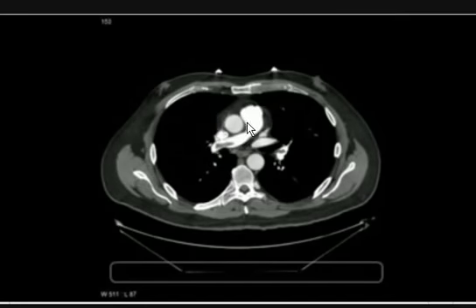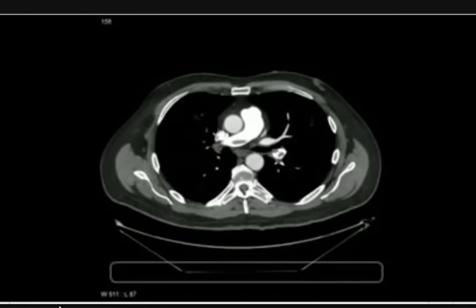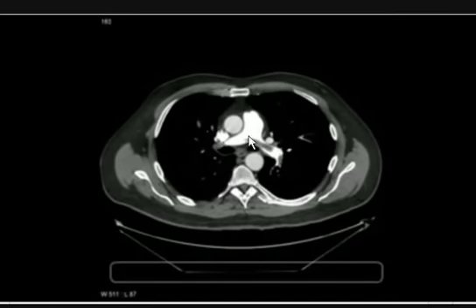The main pulmonary trunk giving off right pulmonary artery, you can see the blood clot here. The clot is also visible here. Okay, this is a very big clot. Okay, going into both pulmonary arteries. The filling defect is also visible here.